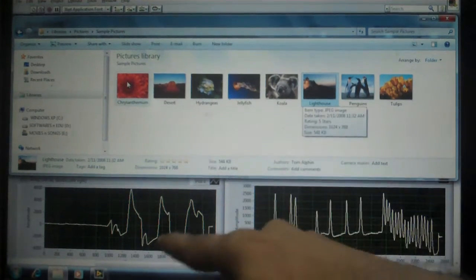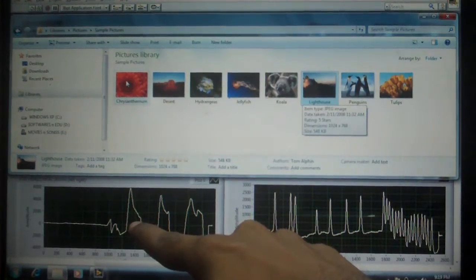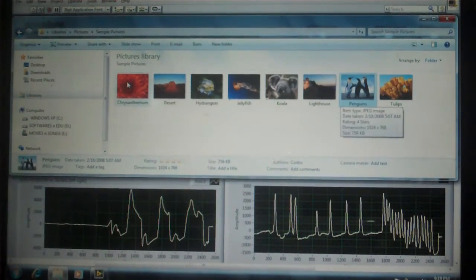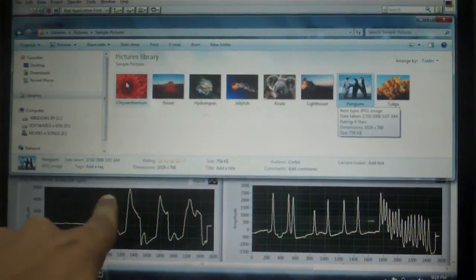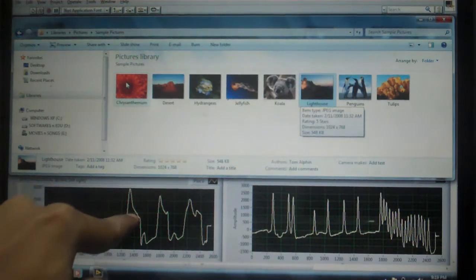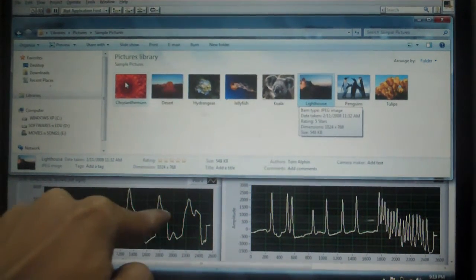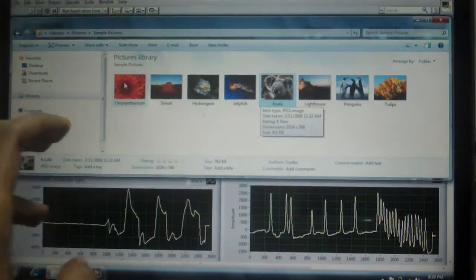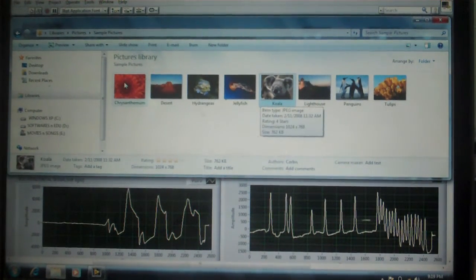So to convert this into a single pulse, we have removed the threshold detector, and instead of that we have employed a peak detector in our currently developed VI, so that when the person gazes towards his right direction, there will be only one transition, not an entire stretch transition as shown when the VI was running. And when the person gazes towards his left, there will be only one transition. That is to say, for this one right pulse, there will be only one trigger pulse which will be sent to the DLL function, and for the left pulse, there will be only one trigger pulse which will be sent to the DLL function. So that the event will occur only once, and this has been done efficiently in our currently developed system VI, and we have also included the vertical component signal there.